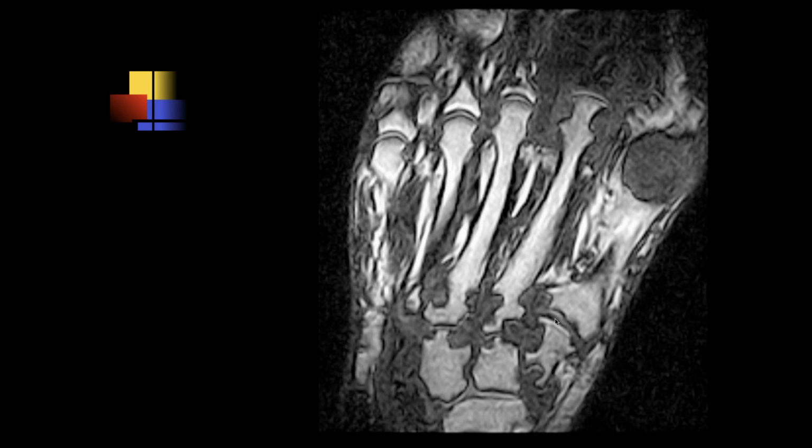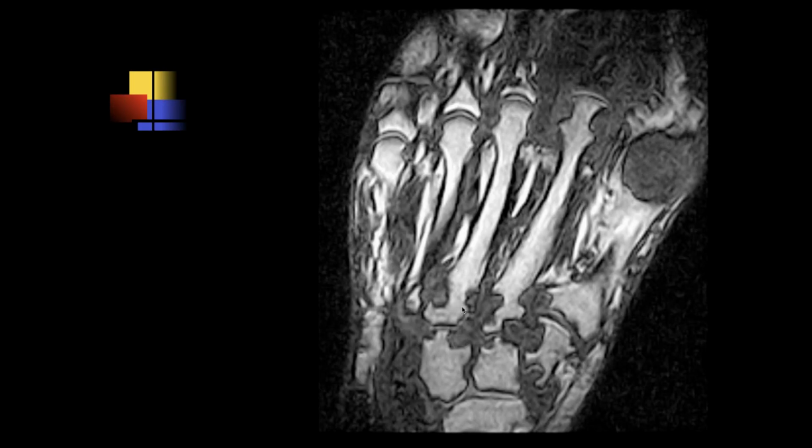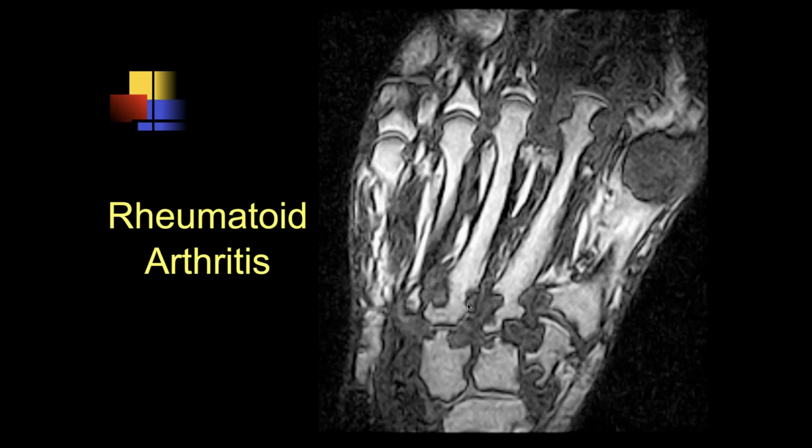Soft tissue erosions. Hello? Just said soft tissue erosions. I think so. That's not soft tissue, that's bone erosion. Oh, soft tissue eroding into bone. Sorry. Okay, I was just a little confused there. I'm easily confused, you know. Yeah. John can tell you that.